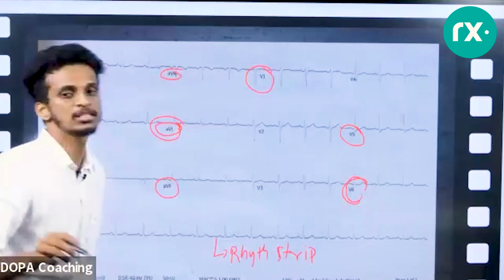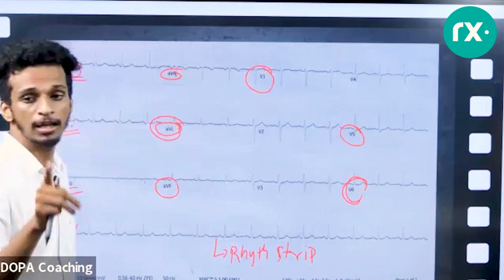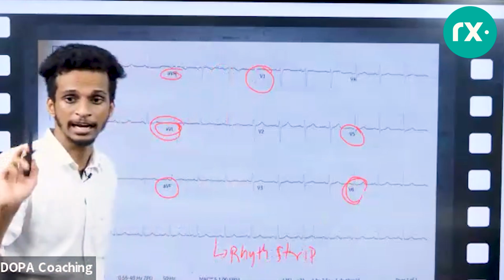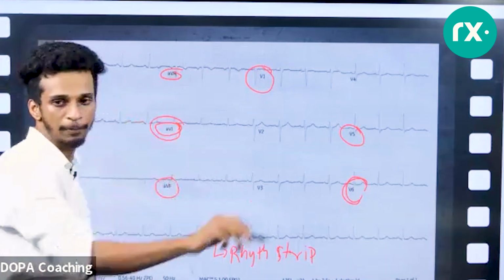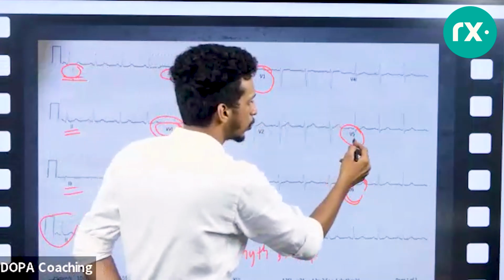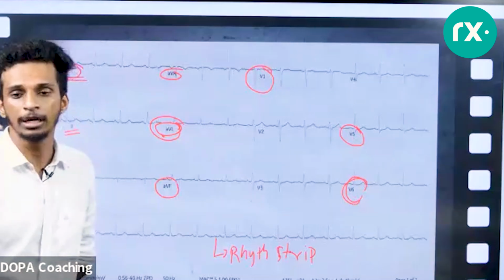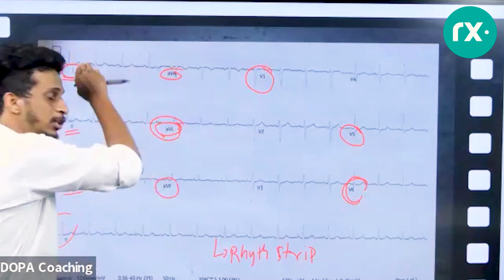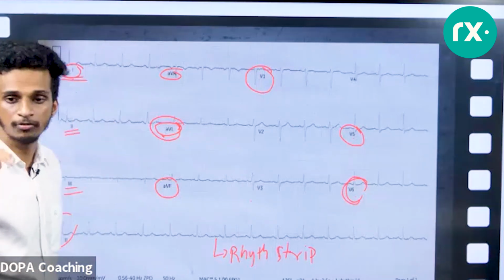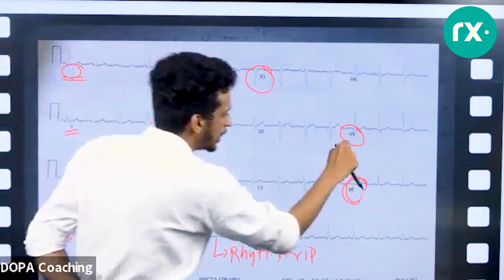By this time, you might be pretty sure why I look at the ECG in that way. Because lead 1, lead AVL, and leads V5 and V6 make the lateral wall. That's why I am looking at the ECG in that pattern. Is that clear? Okay, that's how we interpret an ECG. Even though the ECG is arranged as lead 1, lead 2, lead 3, the walls of the heart correspond like this: the lateral wall corresponds to lead 1, lead AVL, and then leads V5 and V6.